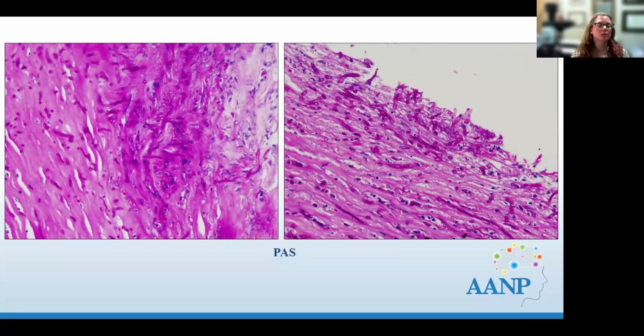So when we do corneas, when you have a penetrating keratoplasty, in terms of your protocol that you order, you have H&E, PAS, H&E, PAS. That's how we do it here. And so you automatically get this PAS to be able to take a good look at the basement membrane, Descemet's membrane, and to look for organisms. So that's a real advantage. I don't know if other places do it differently, but that's how I have been trained, and that's the protocol that we use here.